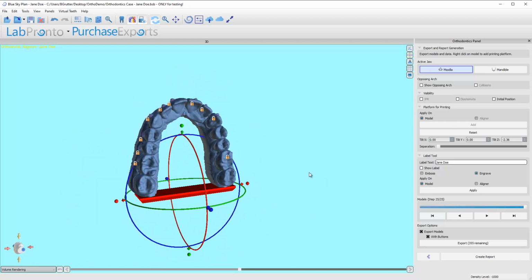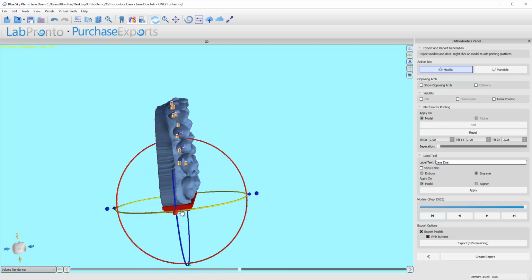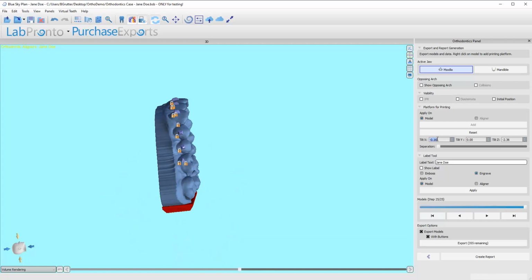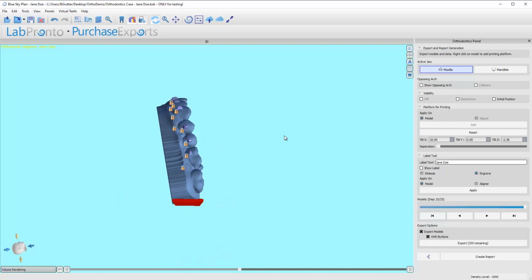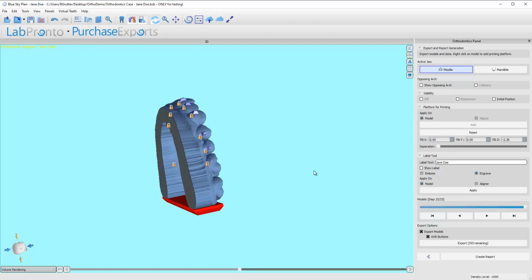Now, you can also tell the software to tilt it however many degrees. This is going to be the X tilt. So if I want this at a positive 10 degrees, you can do that. I only do that if I'm missing a posterior tooth or have severely retroclined incisors, upper or lower. If I have severely retroclined incisors or missing teeth, I will tip it back 10 to 15 degrees. Most of the time, that is not the case. Most of them, I'm putting at 0 degrees.